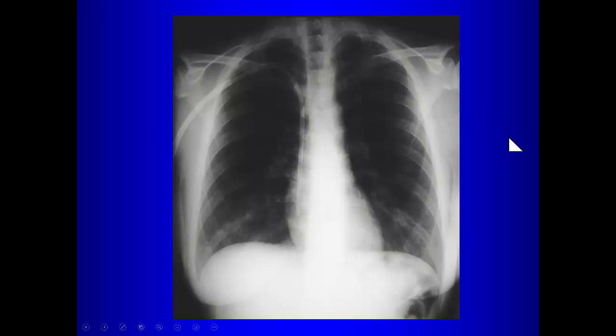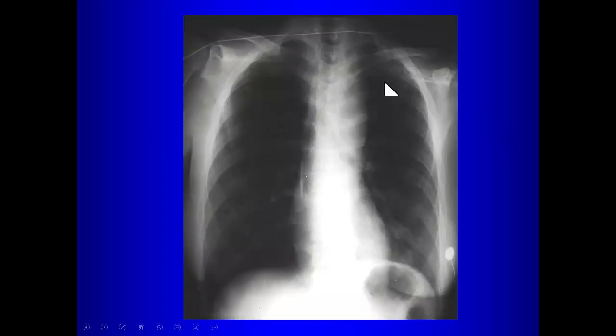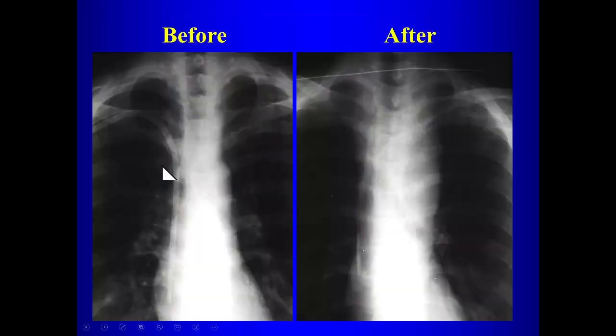This patient has a right central line. That right central line was removed, and they got a left central line. So here's before, right central line. Here's after, left central line. Now when you compare the mediastinum before and after, what do you notice? Yeah, you don't see the aortic knob, and the mediastinum is widened, especially towards the left side. So you see all of this added opacity here on the left side, which wasn't there before, and now it obscures the aortic knob. So what are you thinking about?